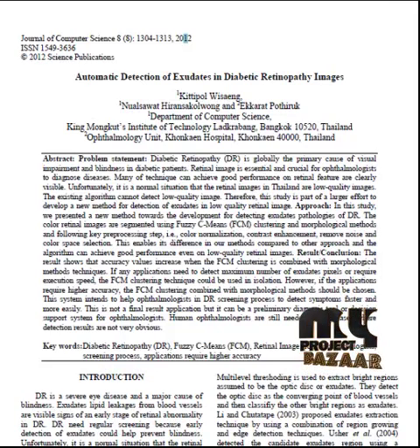The trained features and the test features were passed into the probabilistic neural network classifier. The probabilistic neural network classifier classifies the input retinal images into the four specified categories: a normal image, exudate affected, hemorrhage affected, or microaneurysm affected. So these four defects were identified and the results were displayed. Finally, we are measuring the accuracy, sensitivity and specificity of the classifier, and the results were displayed.